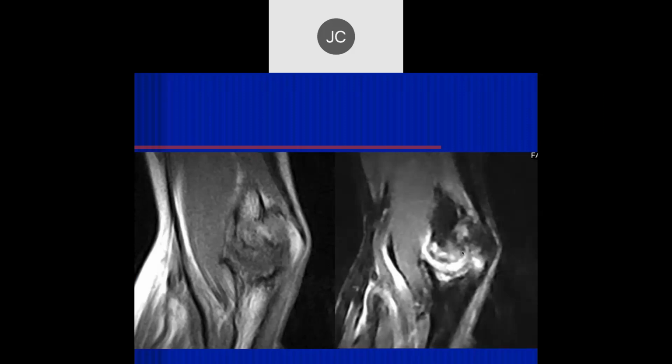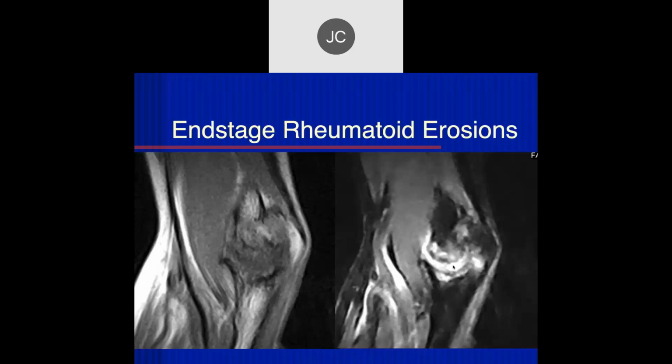In rheumatoid, the erosions tend to be on the periphery, and we'll explain why when we talk about rheumatoid arthritis. But this was a patient, and you're right, this is really the articular surfaces, so this has a broad differential in this case. This certainly could be infectious or post-infectious degenerative disease. Could be trauma. This happened to be end-stage rheumatoid arthritis.